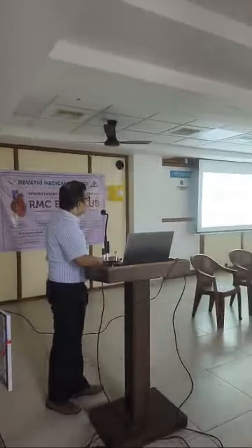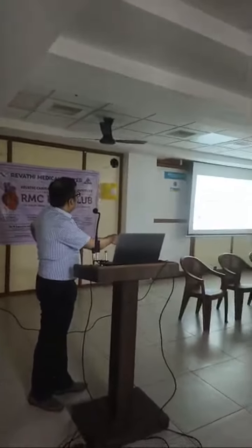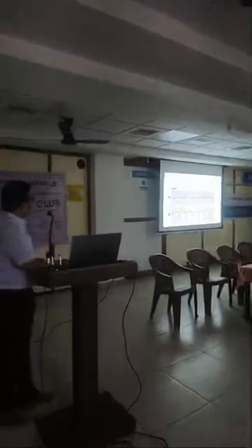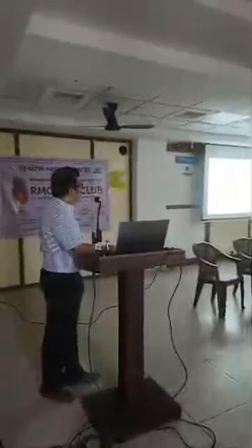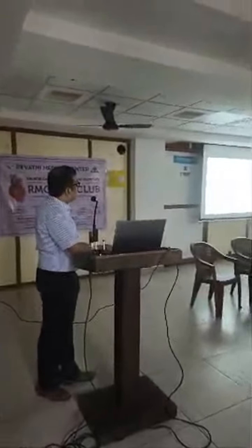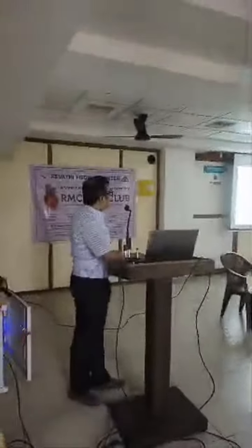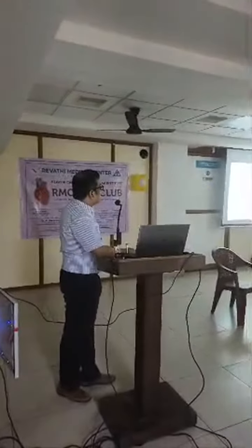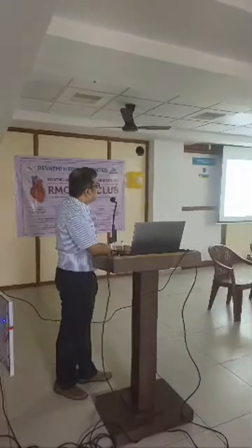So this is the first ECG before treatment, and this is after they have treated it. In the first ECG you can clearly see there is a QRS complex, QRS complex, QRS complex, and the P waves are going separately. You can see that your P waves are going separately and the QRS complex is separately going. With a wider QRS, we call it a ventricular escape. You can see a complete AV dissociation. Your atrial rate and ventricular rate are completely different. The patient has a complete AV dissociation.